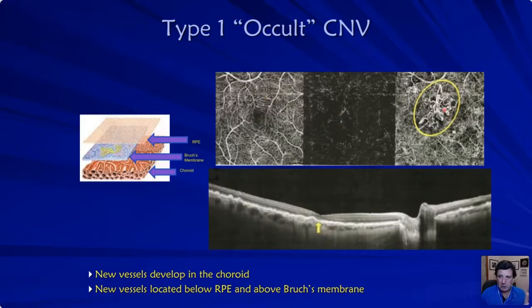Now, if you shoot a fluorescein angiography on this, there is no way that a retinologist is going to see this. Two reasons. One, it's below the RPE. Fluorescein does not see below the RPE. That's ICG, indocyanine green. The fluorescein angiography would not see it because it's below the RPE. But there's a whole other second reason. And the other reason is it's not leaking, right?